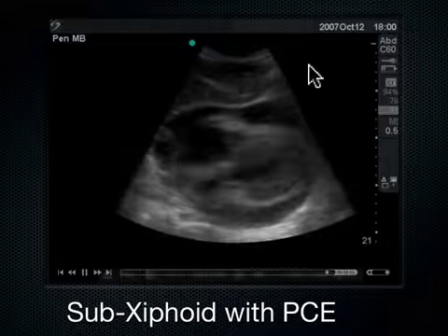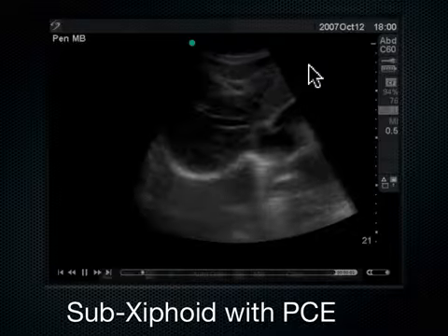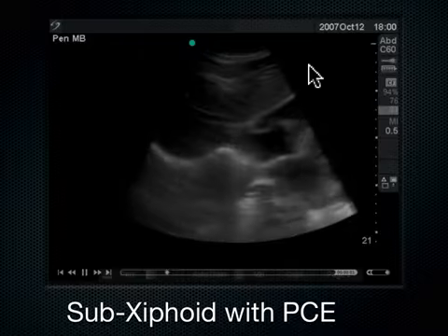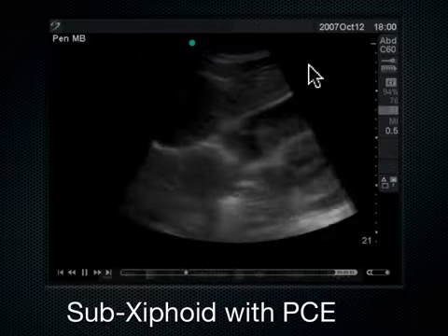The problem is when you have somebody who's a big drinker and a big smoker, where now they've got a tiny cirrhotic liver, and now they've got these huge COPD lungs, and then you're wondering if they have a heart in there at all. It's hard to find. You really got to roll them left lateral decubitus, have them take an enormous breath and hold it, which of course they can't do because they're such bad COPD, and this whole thing becomes a very challenging exam.